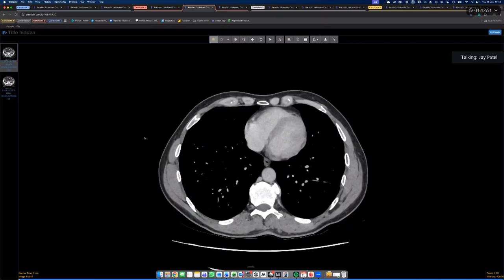That can be quite hard to differentiate between cystic airspace disease, like emphysema, or other cystic change. So if you want to call interstitial change, you really should have fibrotic tractional dilatation of the airways. And actually, when you looked at that on a MIP or a coronal, you didn't really have airway dilatation.